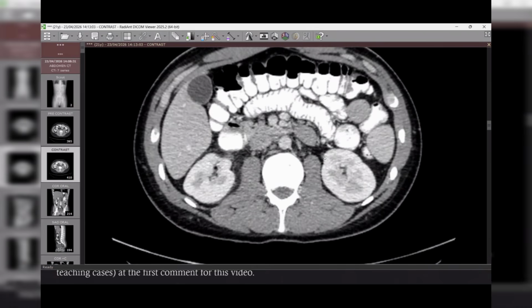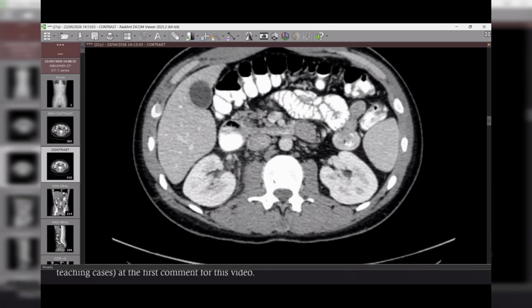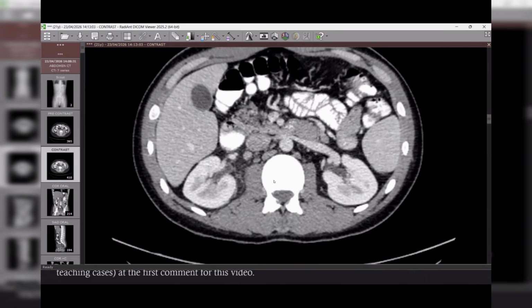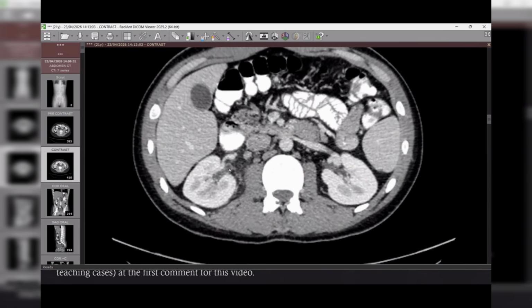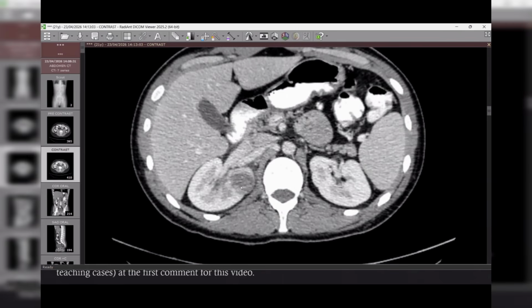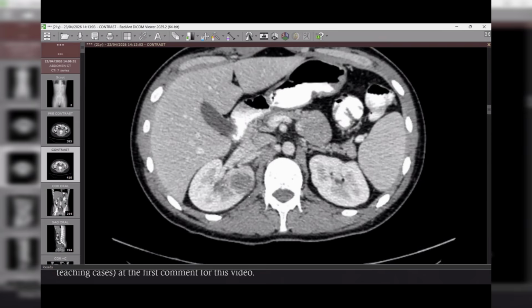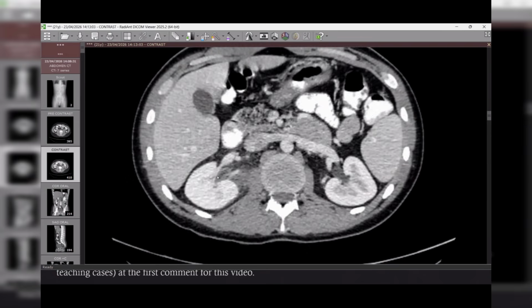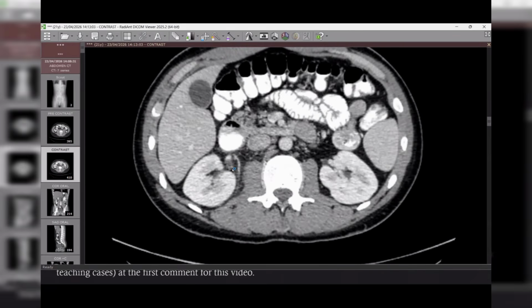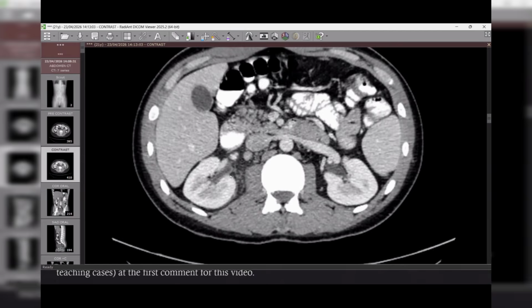So we have some sort of infection, acute pyelitis. This one is acute pyelitis, with enhancement of the wall. This can be the source of infection or secondary to the infectious process in the renal cortex. So this may be the cause, or maybe the complication. But we need to mention this: we have acute pyelitis in the right renal pelvis and right upper ureter.